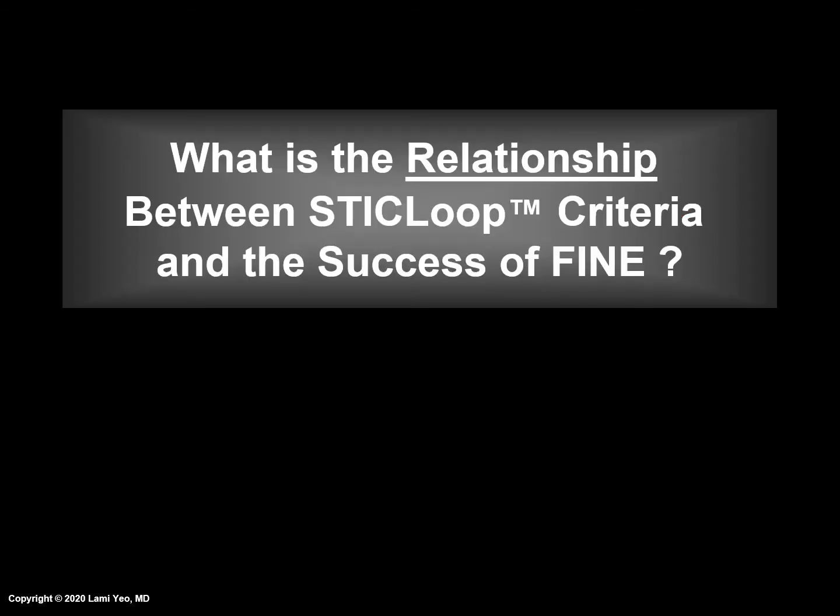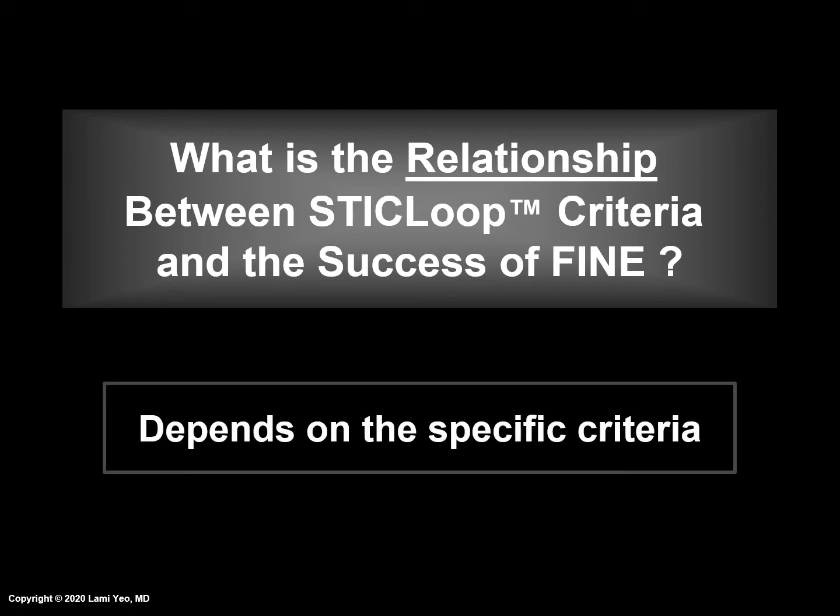Another important question is, what is the relationship between STICLoop criteria and the success of FINE? In other words, if a given STIC volume meets some, but not all of the STICLoop criteria, can the FINE method still be successful in generating cardiac views and depicting structures? The answer is that it depends on the specific criteria.